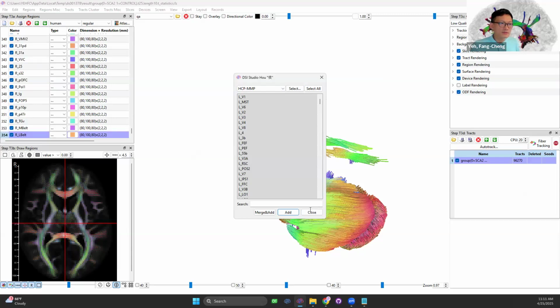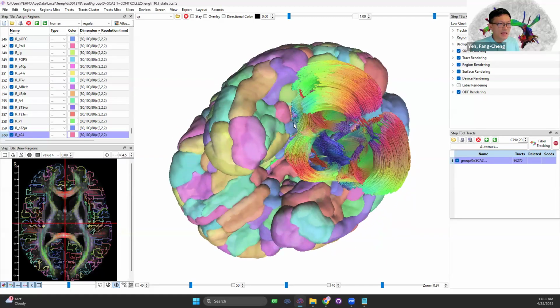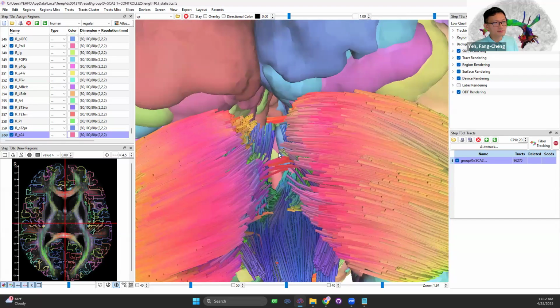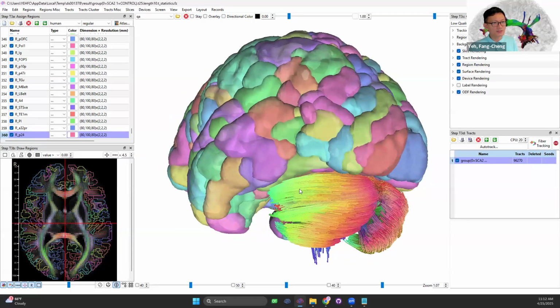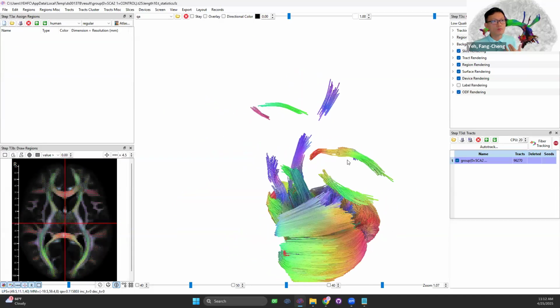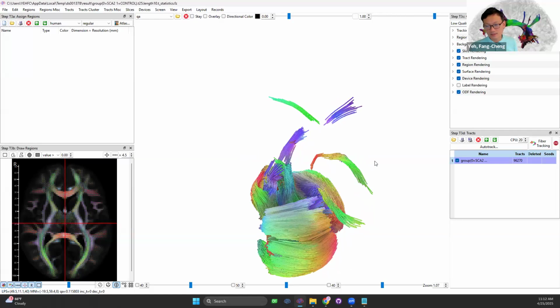But the problem we usually have is that sometimes those findings may not reach the gray matter, and in that case, it may not show up in the connectivity matrix. Also, for example, in this study there are a lot of findings in the cerebellum in the population, including here, and it's not going to report them. So you really need some tricks to report it as a connectivity matrix. One way is that you could use this to extend those tracks and project the possible affected connectivity.